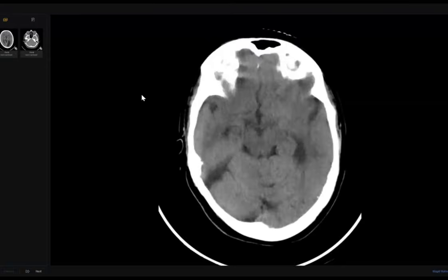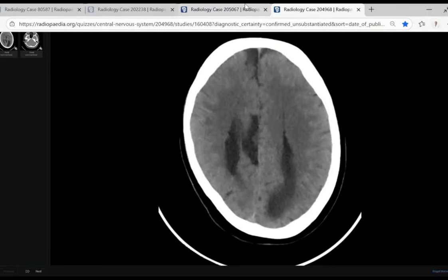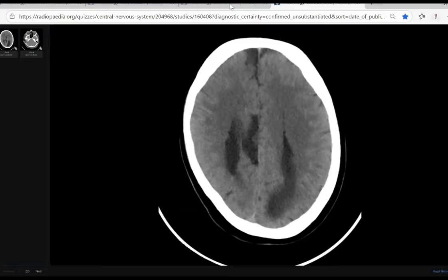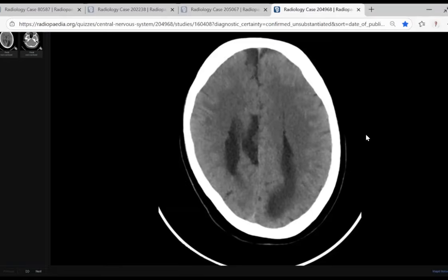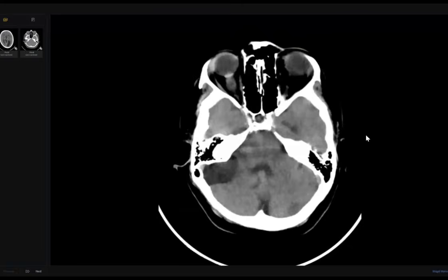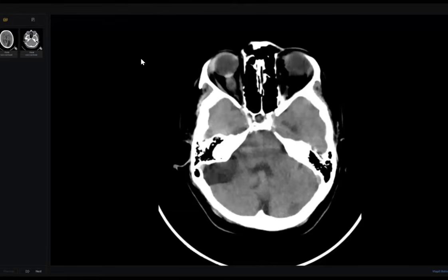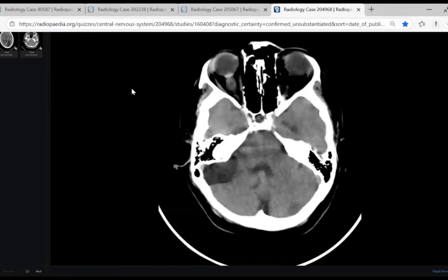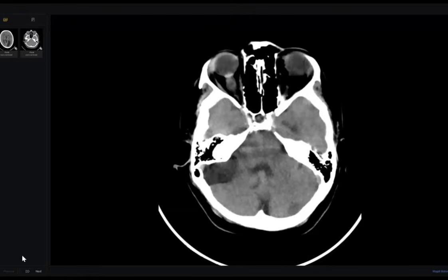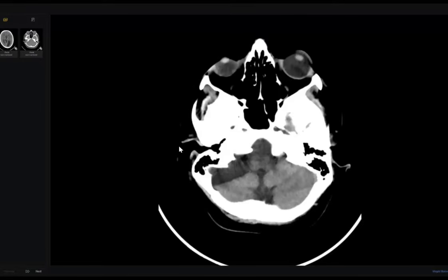What else? Is there any other cuts like coronal or sagittal? No, this is the only available one. Okay. There is no significant edema, I think, no shift, no midline shift or mass effect. Can I see the foramen magnum, please? No crowding of the foramen magnum.